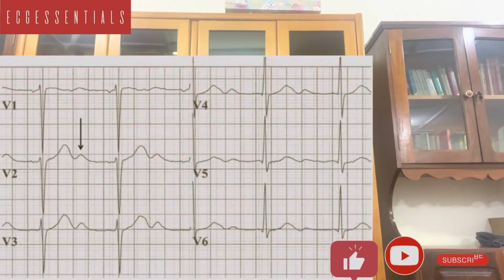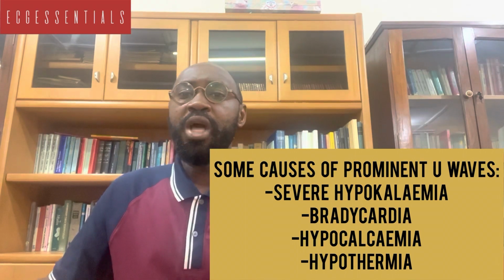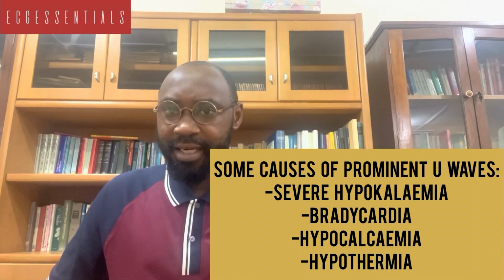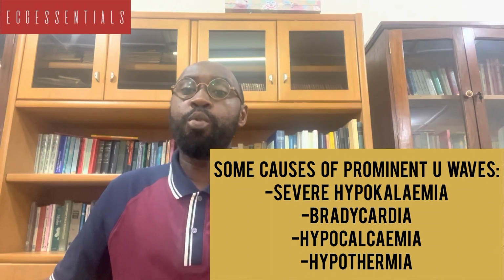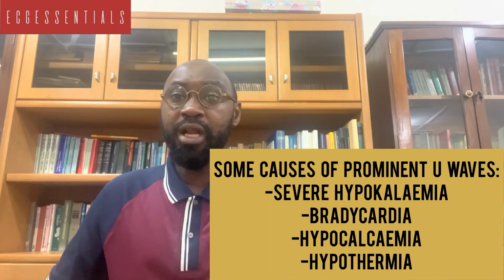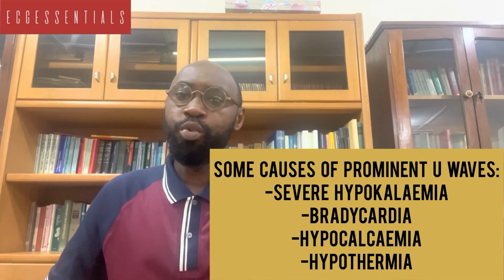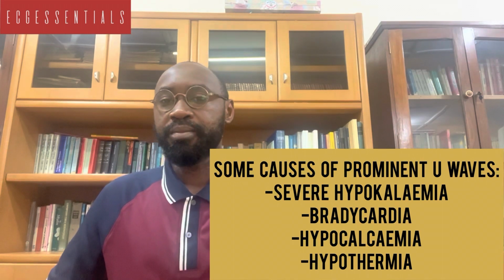With respect to prominent U waves, one of the common causes may be severe hypokalemia, in the ones and around the twos. It can also be due to severe bradycardia, because we have just mentioned that when the heart rate slows down, even in a normal heart, we may see U waves which otherwise would not have been present if the heart rate was faster.